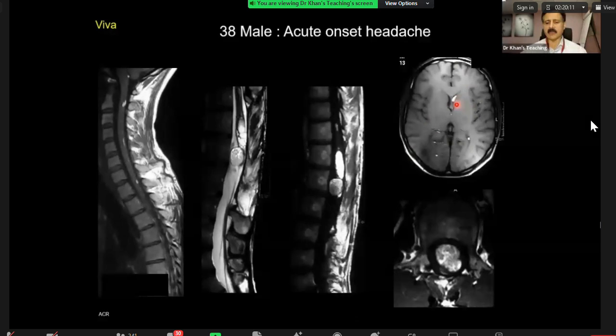On a CT scan, it becomes more difficult because it will be low density, lower than the CSF, and you will tell the examiner you want to do densitometry, because it might be air also. Air is also an exam case, right? So you do the densitometry. And in this particular case, even here, you can see the same thing. And this was another ruptured dermoid.